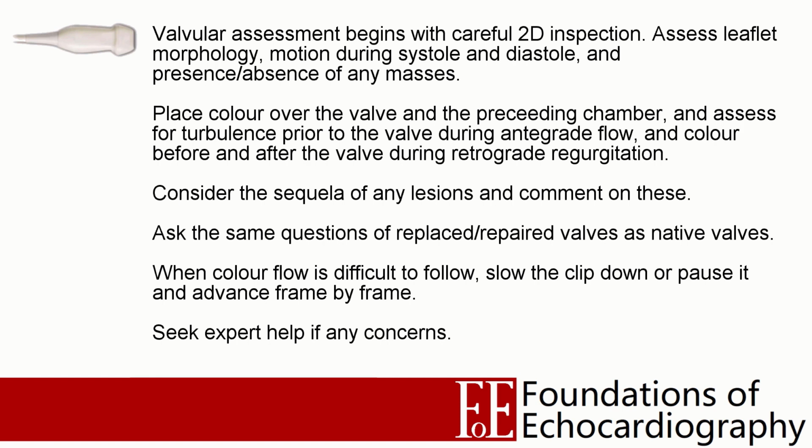When you're faced with a replaced valve or a repaired valve, the questions you want to answer are the same as those for a native valve. How does the valve function as a valve? Does it let blood through when it should? Does it prevent blood flowing backwards when it shouldn't? And if you're ever uncertain, pause your image and advance one frame at a time, paying attention to which phase of a cardiac cycle you're in to help you understand where flow is going. Valvular assessment is challenging, and it's expected that for most valvular lesions, you'll need to seek expert help of a level 2 sonographer to further characterise that lesion.